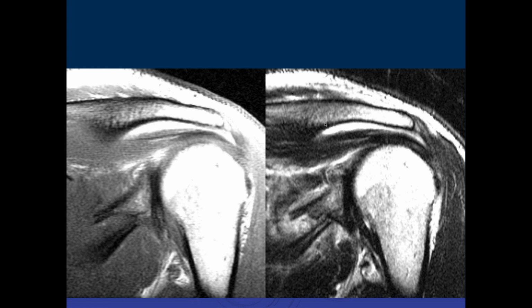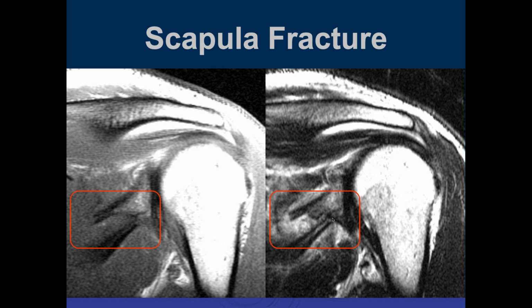Okay. So what I think I'm looking at, there's some irregularity along that glenoid, the inferior aspect of the glenoid. I'm not sure what that dark signal I'm seeing coming in is. This thing? Is that just part of the? What's that? I can't tell if that's cortex of something. Scapula, yeah. So remember, it's a thin sheet, basically, and that's what it looks like when it fractures.